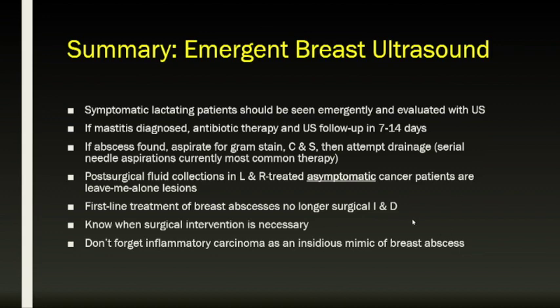So in conclusion, these are my take-home messages regarding emergent breast ultrasound. Symptomatic lactating patients should be seen emergently and evaluated with ultrasound. If mastitis is diagnosed, antibiotic therapy and ultrasound follow-up in 7 to 14 days is important. If an abscess is found, make certain that you send fluid for gram stain, culture and sensitivity, and then attempt to empty it. Post-surgical fluid collections in lumpectomy and radiation therapy treated asymptomatic cancer patients are leave-me-alone lesions, as are the dermal lesions that I mentioned.